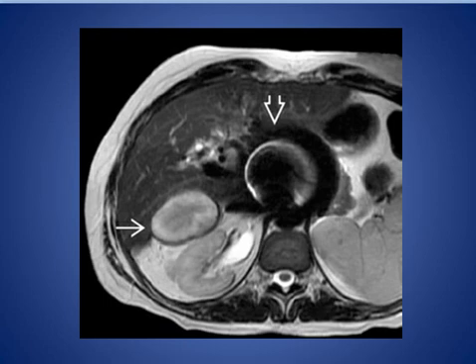As we see here in this patient, we have subhepatic hematoma with the patient post-transplant and encapsulated hepatic lesion bright on T2 weighted images typical of subacute hematoma. And we see here also the artifact due to metallic clips and cords.